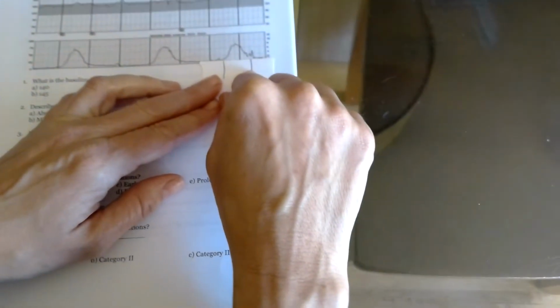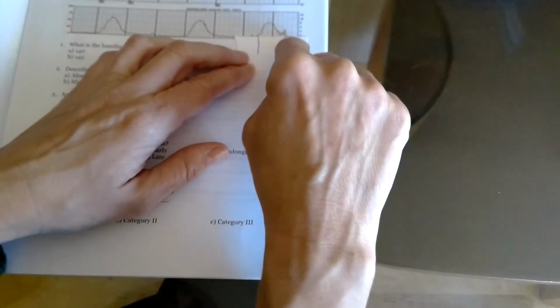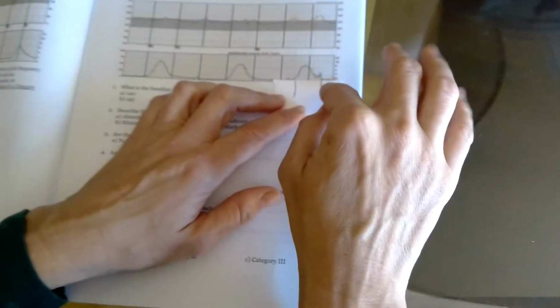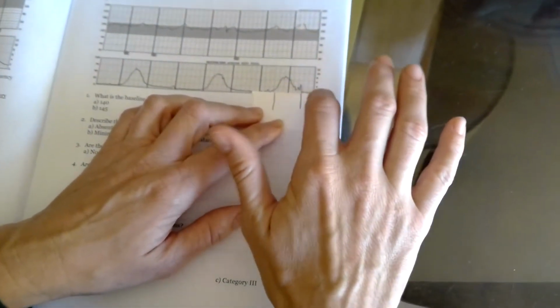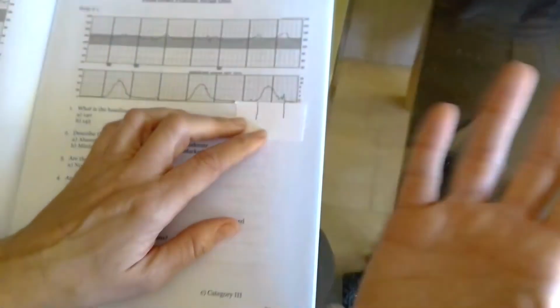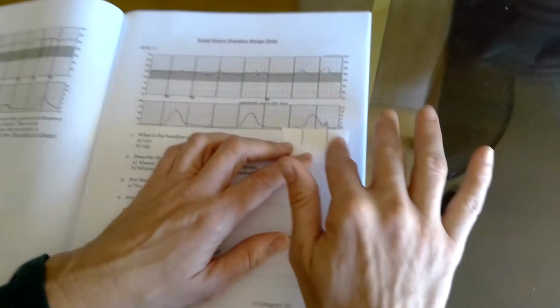And then we're going to move to the third one. Again, putting the first line where it first starts to go up. And we can see here with the second one, this third contraction is nicely within these two lines. So this is going to be just about 60 seconds. Now, if this contraction lasted one or two boxes longer, we know each box is 10 seconds, then we could just add that many seconds. So if this one was longer, we could possibly add one or two boxes, making it 70 or 80 seconds.